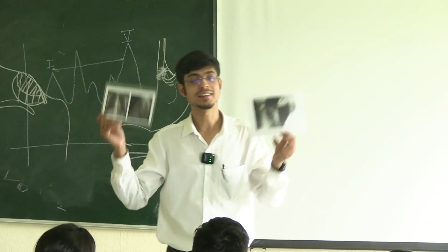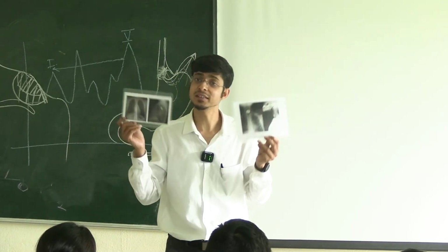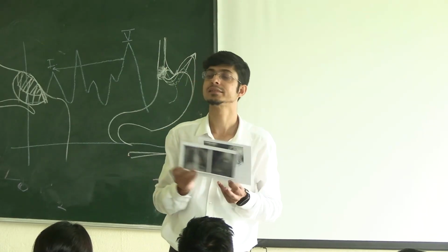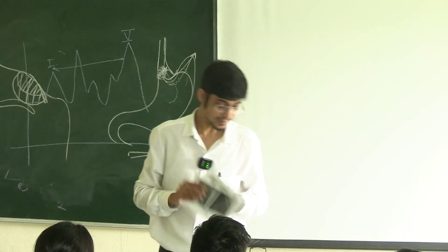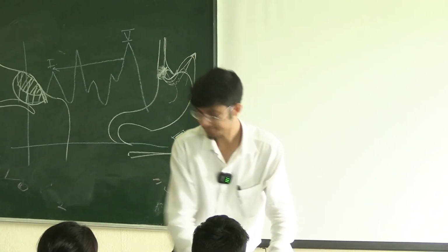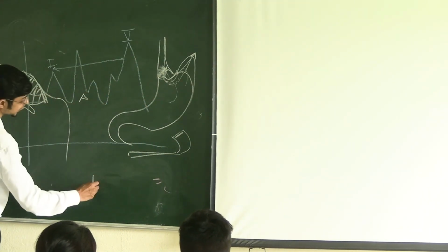Okay. Why are you saying that the orientation is like this? Why is the orientation always like this? That is the point. So the vocal cord, if you see, this is anterior and this is posterior.